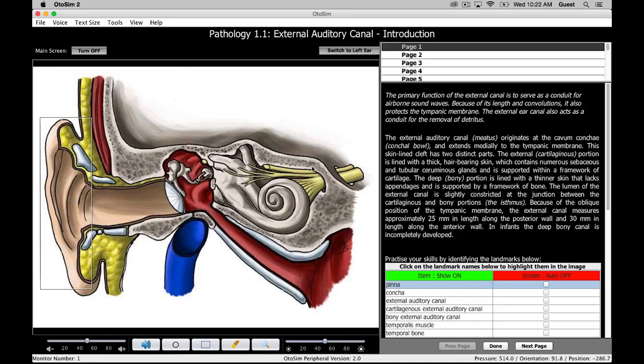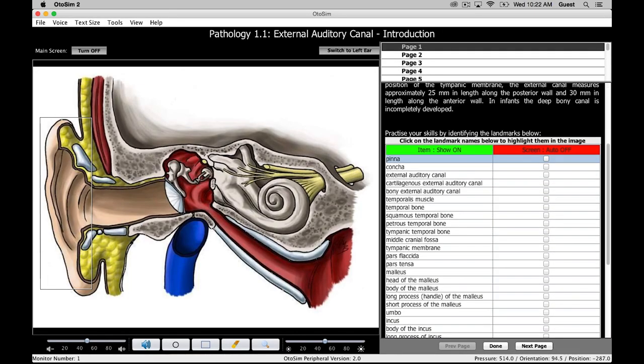So in the introduction section now, we will repeat some of the things that we learned in the first part with respect to our anatomical knowledge. And you'll see again when these two charts appear that we now can identify the structures both on the main screen, as this first picture is not to be used in the simulator, but again to review some of the relevant anatomy, is the teaching ability of an instructor to the student.